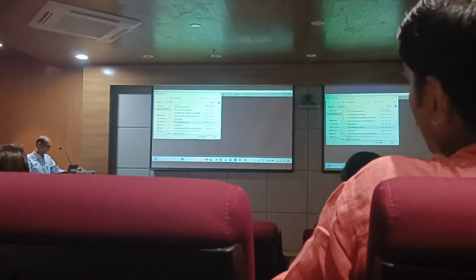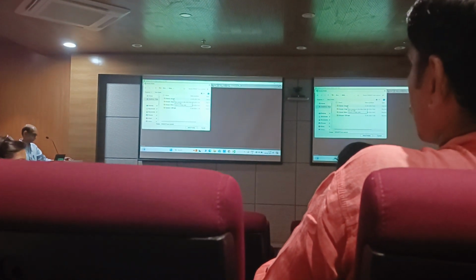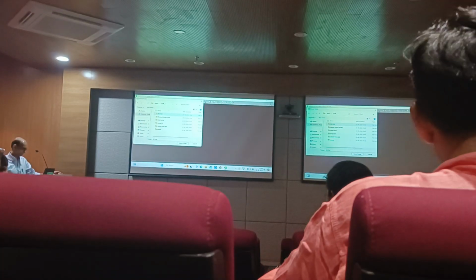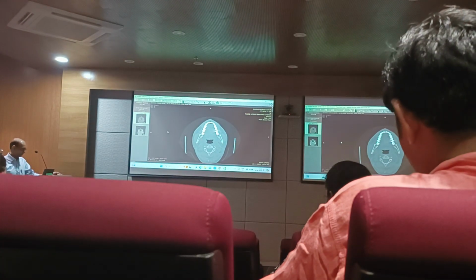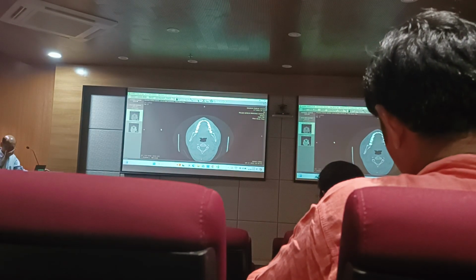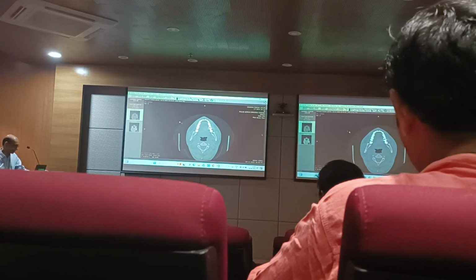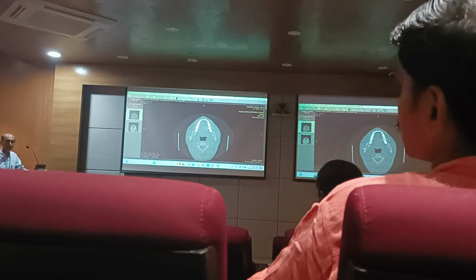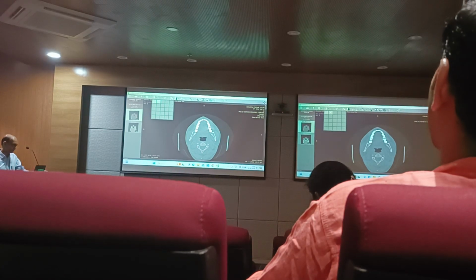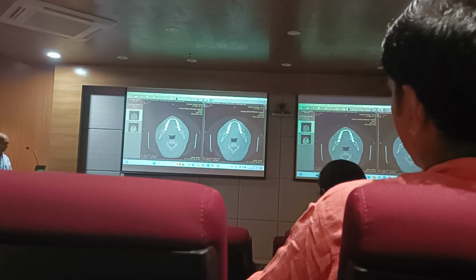Okay. So let me run you through some scans. I want you all to read the scans rather than me. I'm just going to move it around for you all. The advantage of doing the scan in this way is you can actually make two windows, and we can have similarly over here plain bone thin, and we can change that.